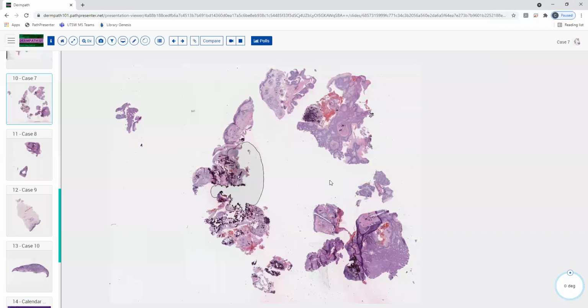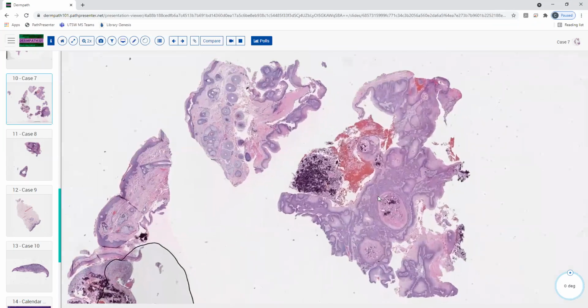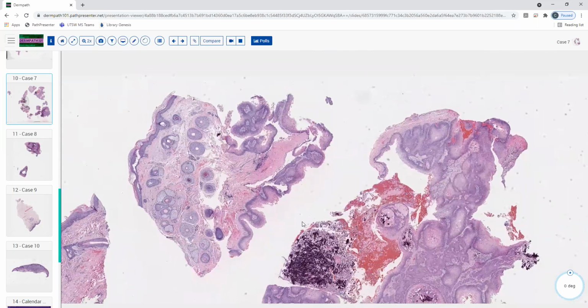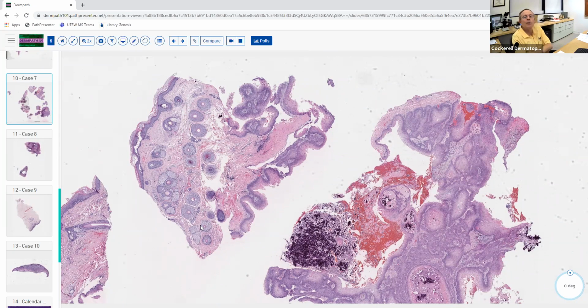The part that I focused most on was the very top, and then the part that's to the right of it. Okay. So on the left, I see a lot of hair follicles in the dermis. That makes me think we could possibly be in the scalp. Yeah, good, excellent, very good. And I think that's helpful. We always talk about asking what part of the body something is from, and knowing this is from the scalp is helpful, because that's where this lesion almost always occurs.